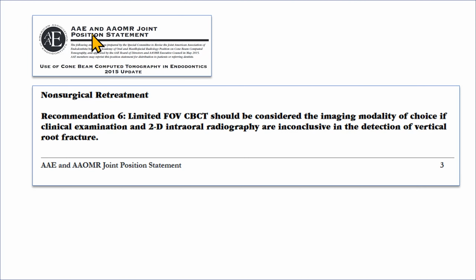In a joint statement issued by the American Academy of Oral and Maxillofacial Radiology and the American Association of Endodontists, these organizations recommend that limited field of view CBCT should be considered the imaging modality of choice if clinical examination and 2D intraoral radiography are inconclusive in the detection of vertical root fracture. We have a limited field of view CBCT scan.